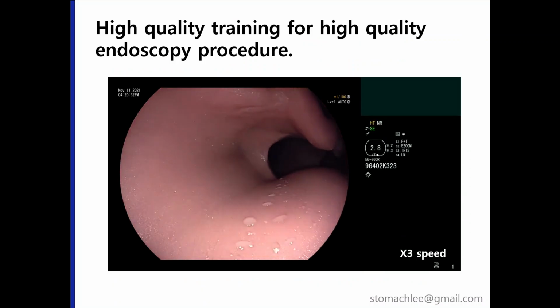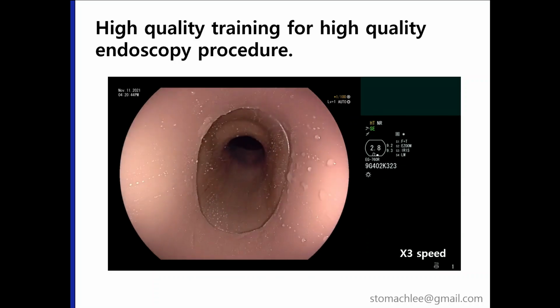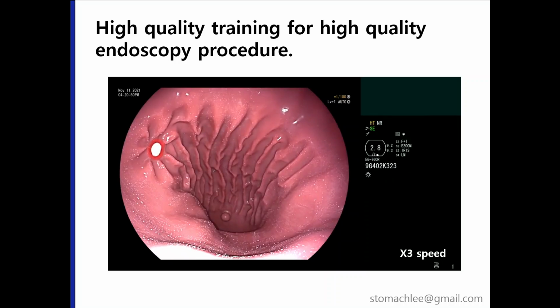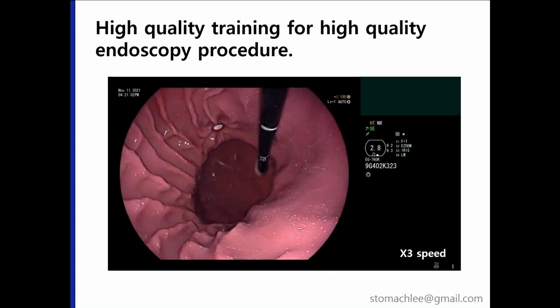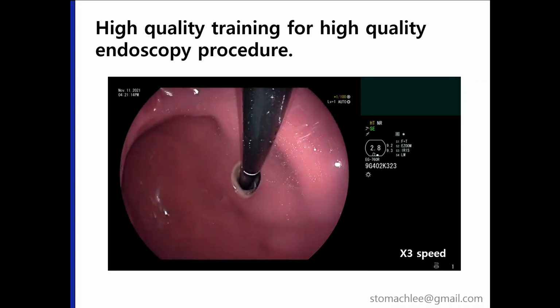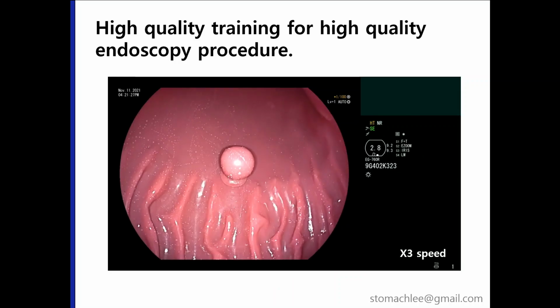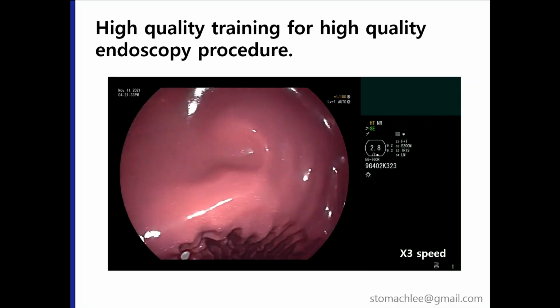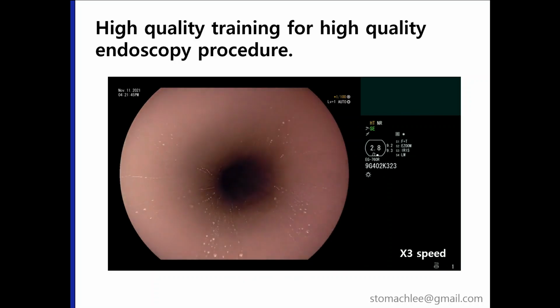In order to develop a high-quality endoscopy procedural routine, high-quality training is very important, especially for the beginners. I recommend box simulator training. Don't be surprised, this is a high-speed video clip. You should do it very slowly.